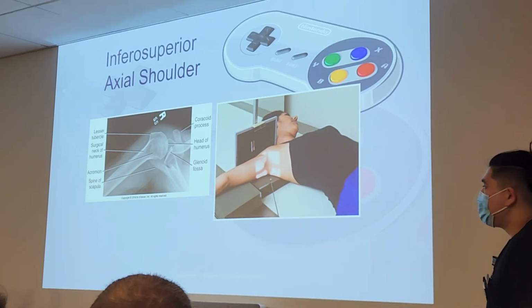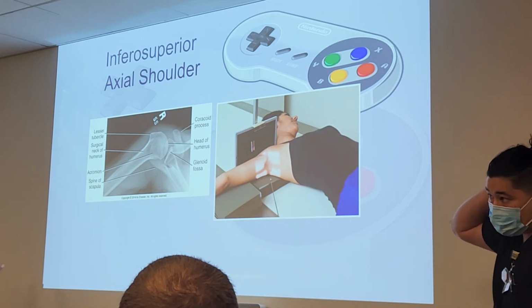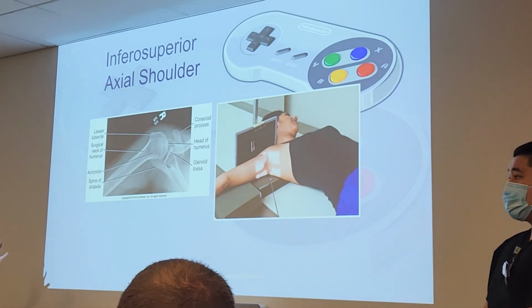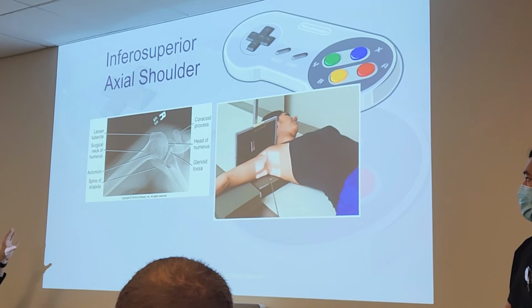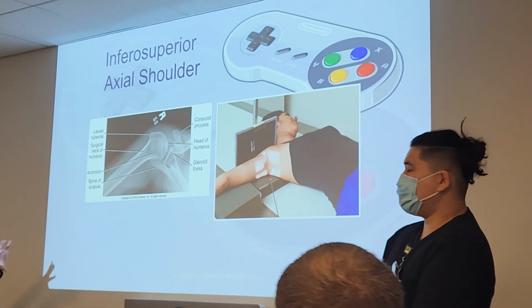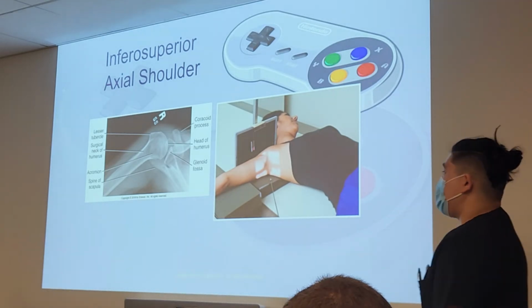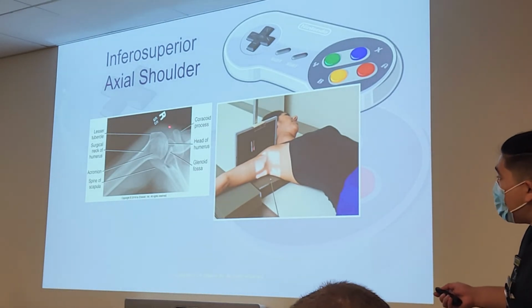This is a very important view to know, guys. It's one of our trauma things. You're gonna learn how to do this tomorrow on Thursday. But put this in here because you can see it's a vastly different looking x-ray. A lot of that anatomy we just talked about is gonna change positions quite a bit.